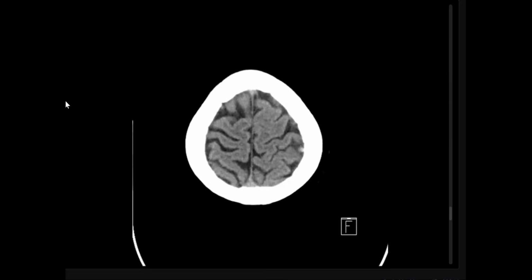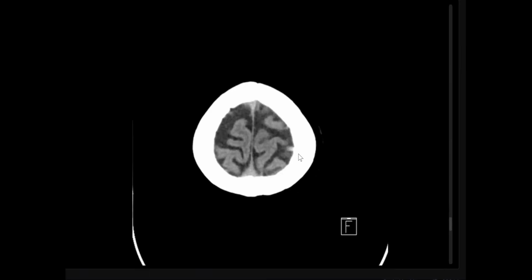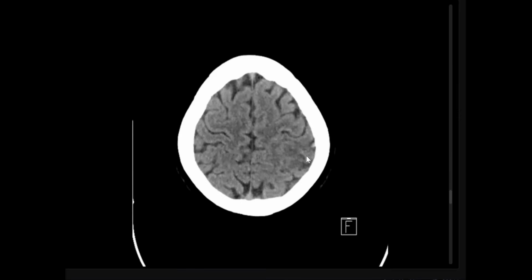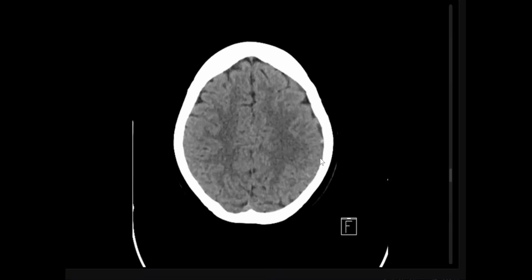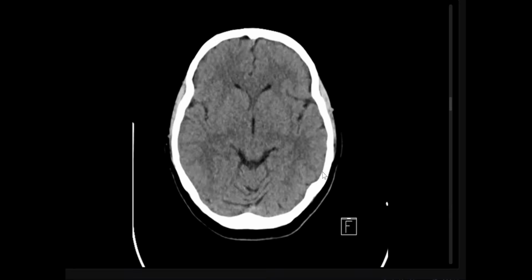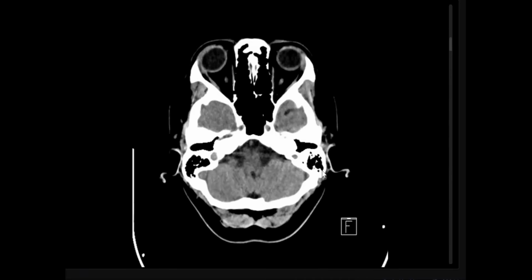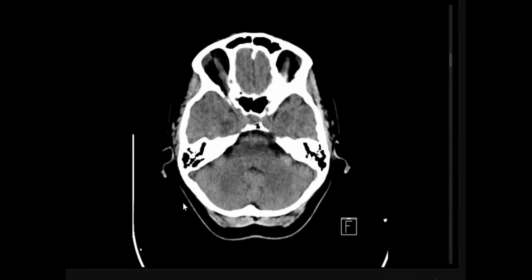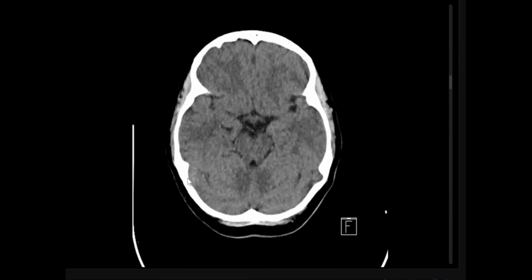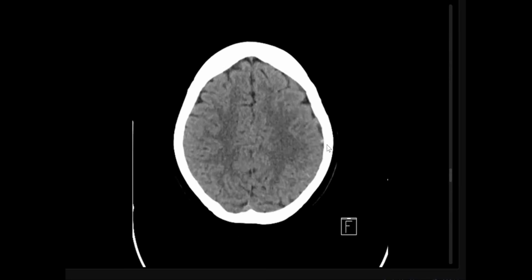If hypertensive, it may cause PRES. What I can see in the left cortical vein is hyperdensity, a left cortical vein which appears hyperdense. Looking at the other venous sinuses for any thrombosis, hypercoagulable status, yes, pregnancy causes a hypercoagulable status. Definitely you should assess and tell the examiner, I'm looking for the venous sinuses, not just the vessels. Okay, you noticed an abnormality.